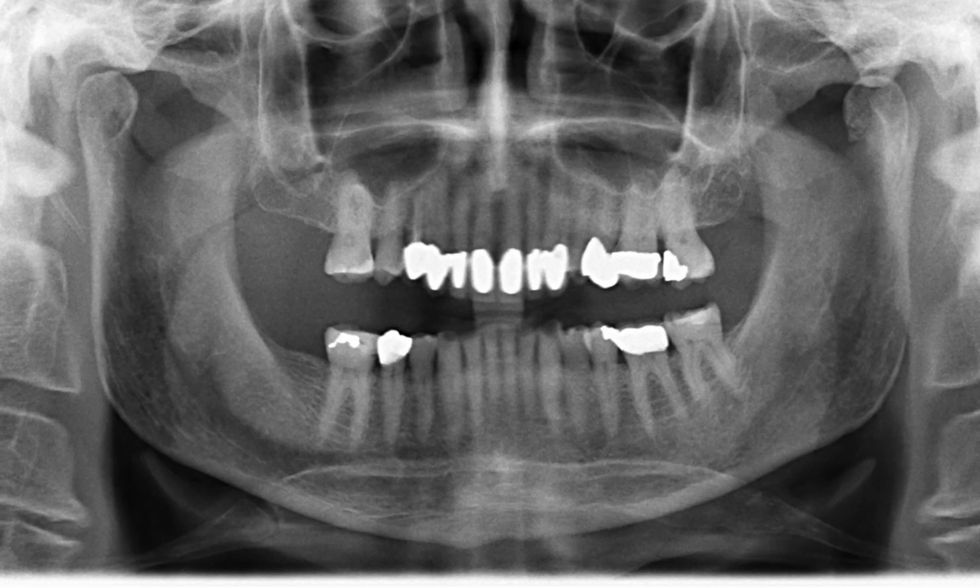Hi everyone, I have a really exciting case to share with you today. As you've already seen in the title, you know what this case is about, but for a second pretend as if you don't know about this case and just look at this radiograph.